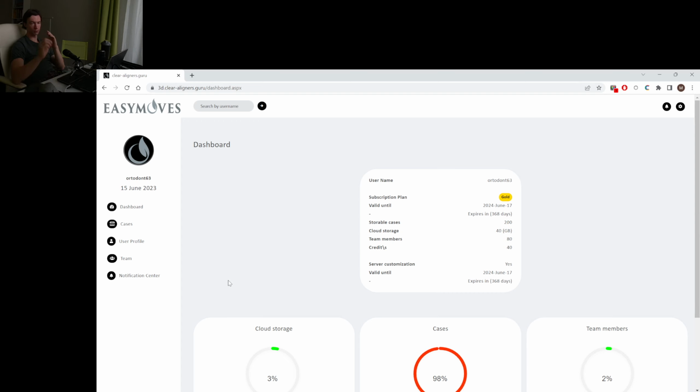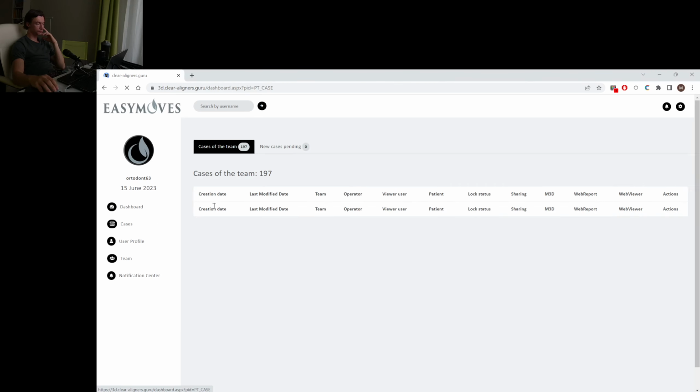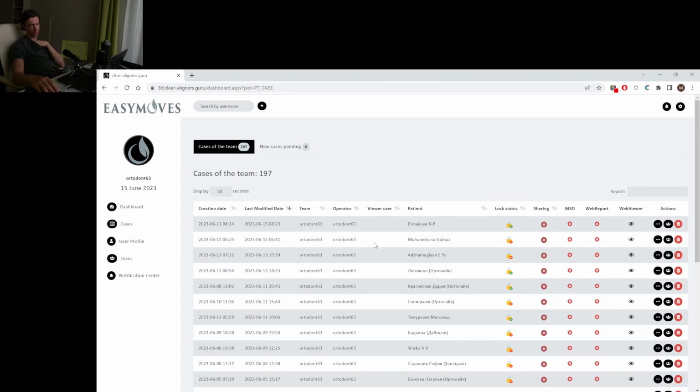I think we can complete this treatment within 10 months or something. I'm going to use Endura FLX for this case.